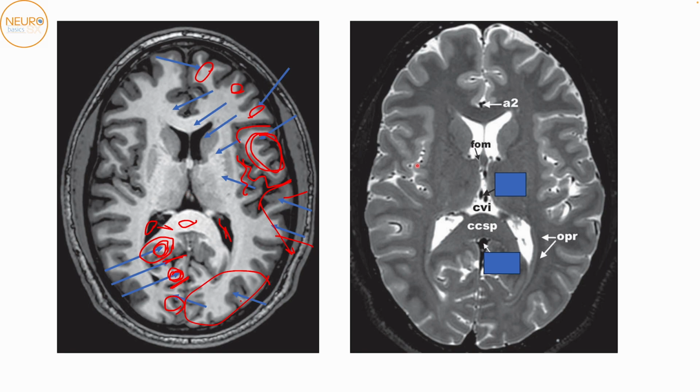These ones. So these are, as we know, vessels are a lot more obvious when it comes to T2. So we can see these very hypointense structures running within the third ventricle. That is your internal cerebral veins. Posteriorly, you can see another very obvious hypointense structure, which is running posteriorly. This would be the vein of Galen over here.